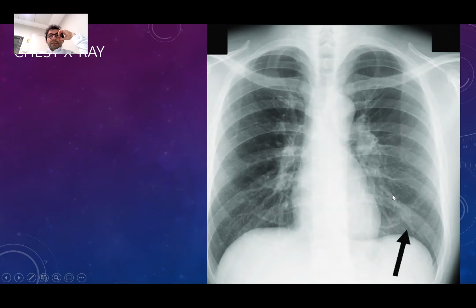I look at the systematical review. The bones, I started from outside, that's my way. The bones are okay. The costophrenic blunting is not present. The costophrenic sinuses are open. Diaphragms are open. Pleural linings are all fine. Heart is not enlarged. Aortic arch is normal sized.